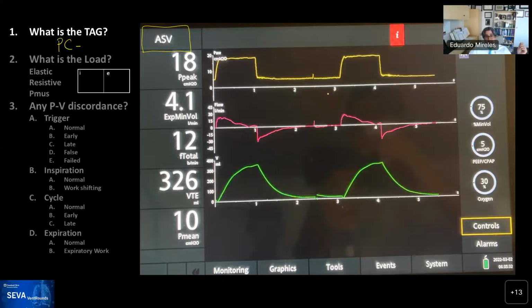And you'll see this in this type of ventilator in particular, the flow sensor is at the Y, meaning by the trachea. And so sometimes you don't see as beautiful as you want. Yeah, good point. At that time, it will not look as nicely exponential decay, but you have to see through it. There's some aberrancies that are happening in between.